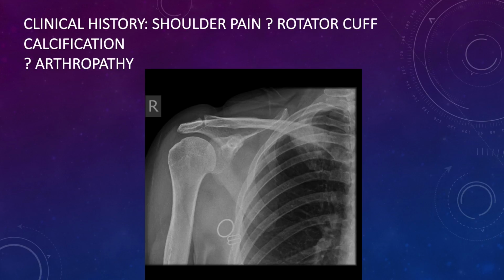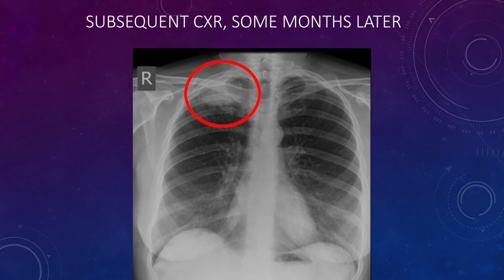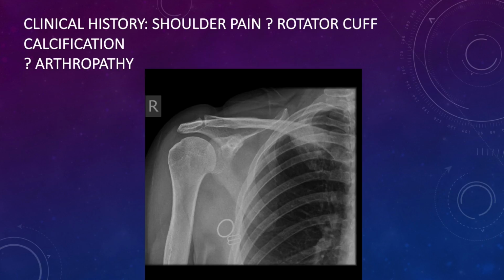Now it's there, okay, some people spot it straight away, other people you just don't see it, but you've got to start thinking about it. These do present in that type of manner as well. They've probably been to a physio, CATS or advanced practice physio. They're probably being treated for impingement or something along those lines. So you need to think about the lung apex. Obviously, I could show you bad or abnormal films, but you will spot those easily. This is just to get you thinking about the more subtle pathologies.